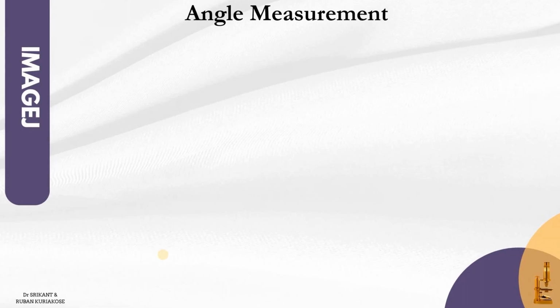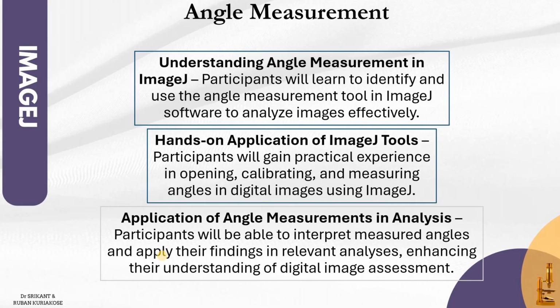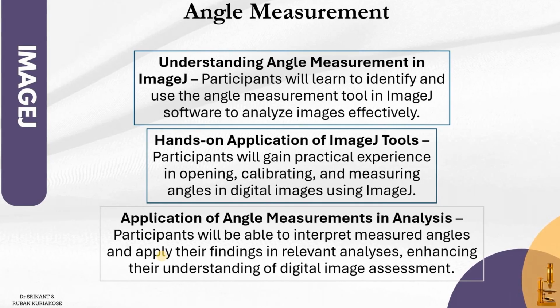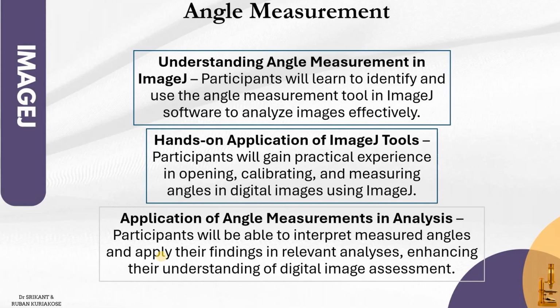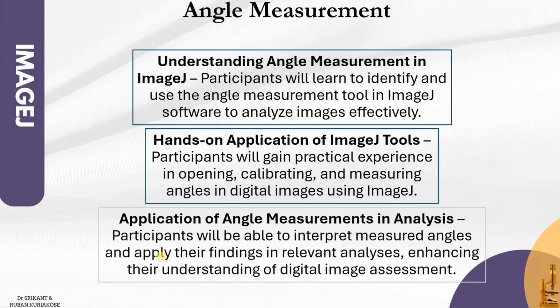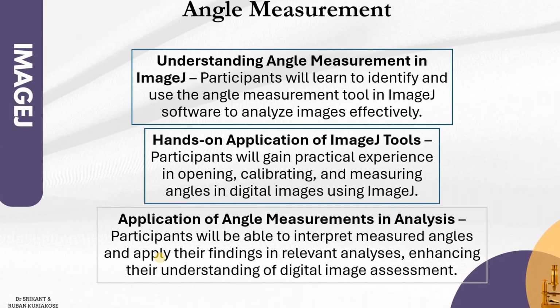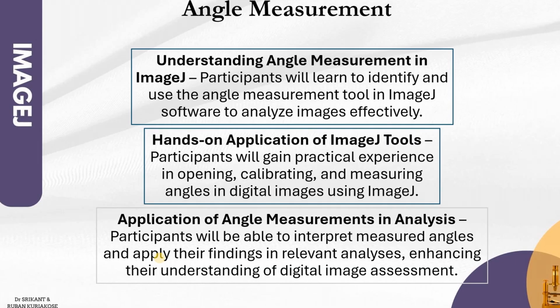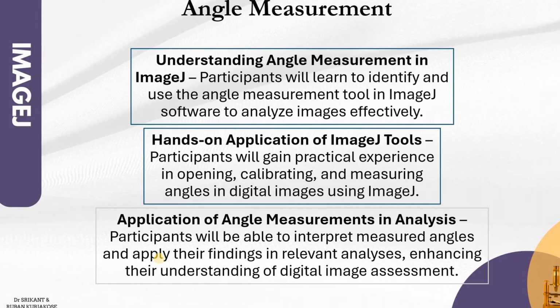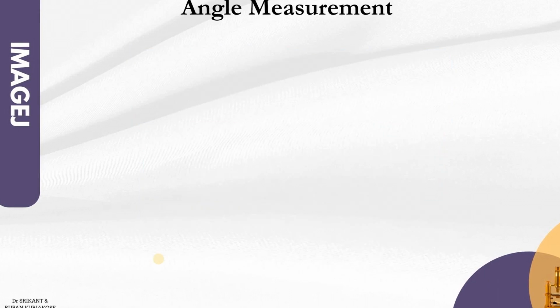Here we are going to talk about the angle measurements. The objectives of this demonstration would be to understand angle measurements in ImageJ. We will also give you a hands-on demonstration of opening, calibrating and measuring the angles of digital images using ImageJ. We'll give you an application of angle measurements in a cephalogram. So let's jump right into this process.